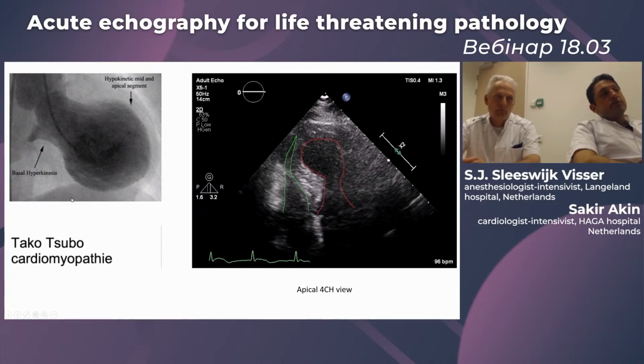In these patients, on the EKG there are many times ST elevated myocardial infarction signs, and when you go to the cath lab, you will find non-obstructive coronaries, and in the LV angiogram here, left above, you will see a ballooning apical left ventricle, which we can also show on the four-chamber echocardiography as a non-moving akinetic apex of the left ventricle, which is ballooning, while the base of the heart is moving, and the right ventricle moves quite normally.